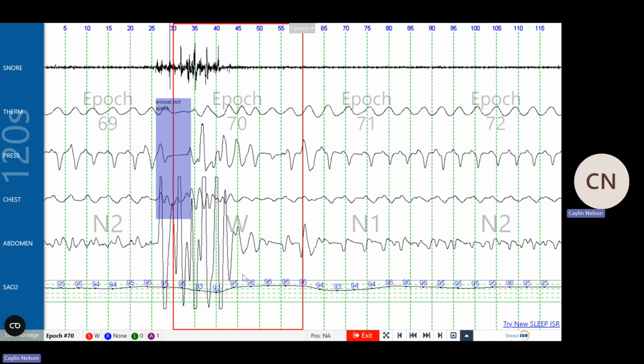But when it comes to highlighting areas in just the regular sleep world, you'd highlight that full area as the arousal, because instead of doing epoch by epoch and saying if there's any events in there, all you'll be doing is basically making annotations like that blue box I have up there.